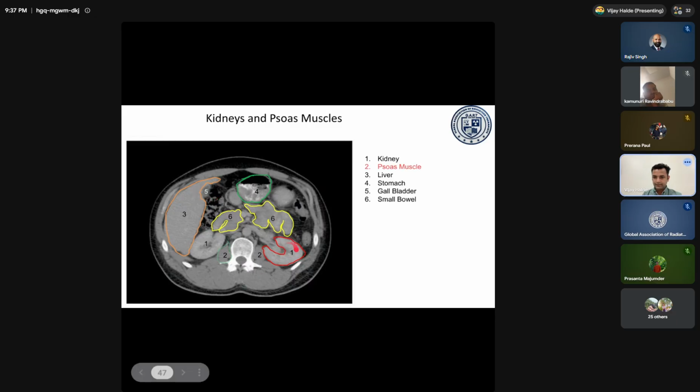These are the kidneys. This is the left kidney. This is the right kidney. You can clearly see them in the CBCT images or the CT images. So the bladder filling protocol is a must in the abdominal region, especially.